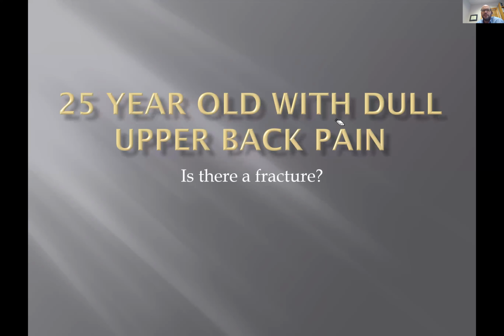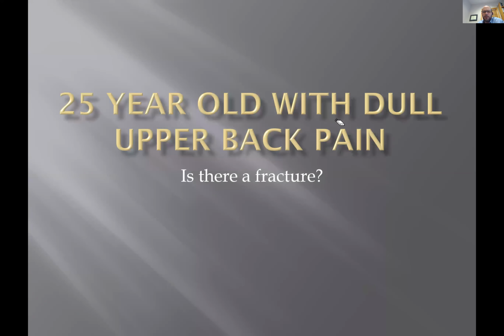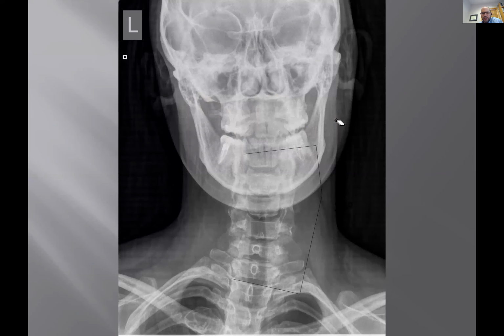Here's the 25-year-old with dull upper back pain. All right, this is fun. I'll end with this one. Nice little curve there. 25-year-old, dull upper back pain. Don't worry about is there a fracture. Where is the finding? Detection.